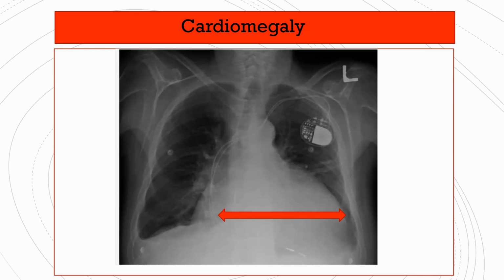Yeah, just a red arrow to really highlight how large this heart is, okay? Cardiomegaly, heart failure. It makes sense because they have a pacemaker, so they're trying to make the heart pump again, but it's not really, you know, it's failing.